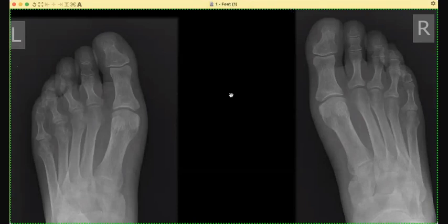Why did you say gout? What is in favor of the findings as far as gout is concerned? In favor of gout, there is no intra-articular affection, but there is cortical erosion around the joint. Which joints? The metatarsophalangeal joint.